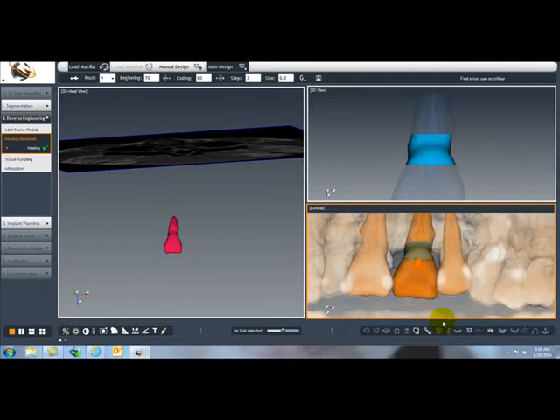So this is again a new release of the software that's very useful for periodontists and surgeons, and people love it because now you can pre-order the final abutment and the temporary tooth that will be a copy of the adjacent tooth in there, and you don't have to worry about human intervention in terms of fabricating a tooth. So I will proceed next to the implant planning process.